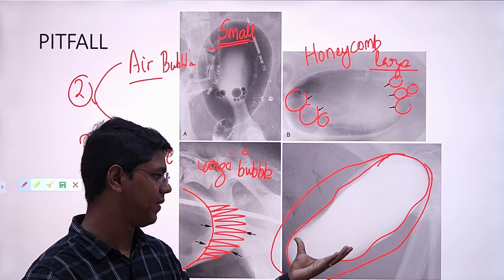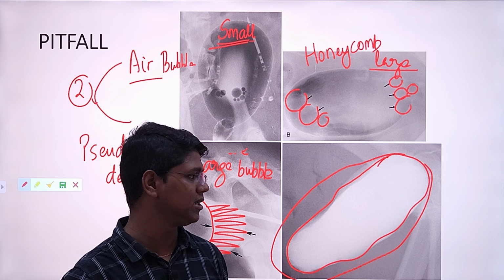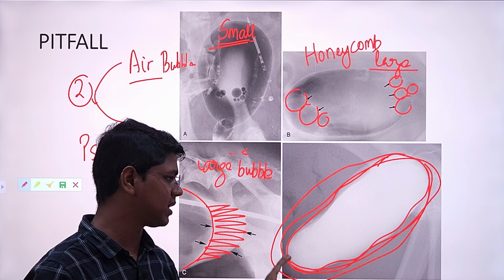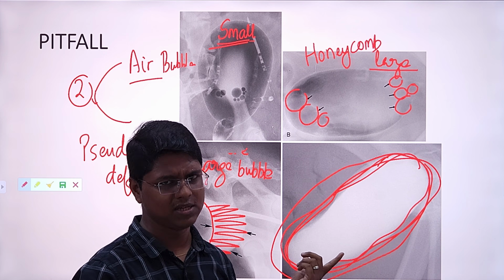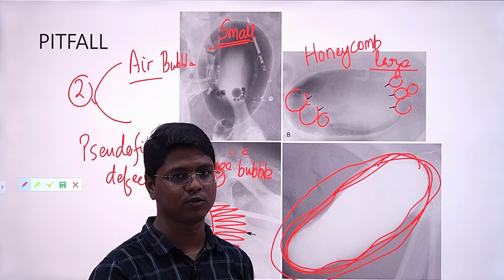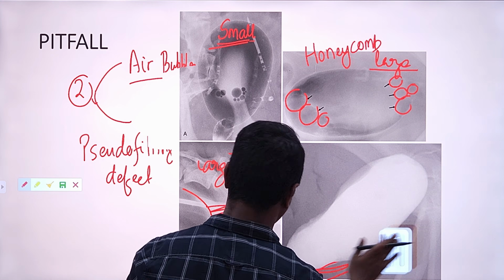Okay, so this defect can be corrected by distension. You have to distend slightly more, to a moderate level, then you can find the positive contrast, or you can find some pathology if it is there. Otherwise you may diagnose this as some pathology. Especially in books it is written that when you find pseudo-filling defect, it is usually misdiagnosed as neoplasia. So you have to know about these defects.